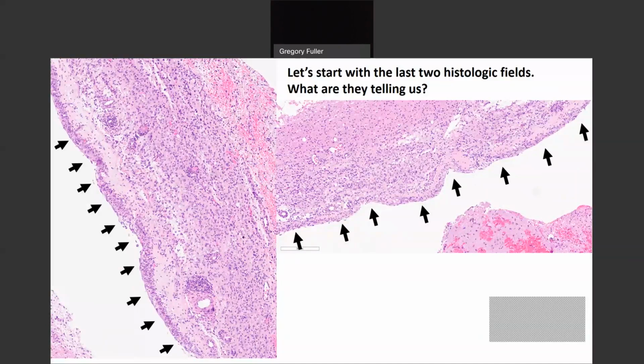Now that's informative. Now, how do you recognize that? Maybe for the neuroradiologist, it's not so intuitive. When we're looking at tissue fragments, you can see natural boundaries. This would be like, say, the molecular layer, the pia, at the surface of the cortex, surface of the cerebellum. You can see sharp cuts, which would be scalpel cuts, either from the surgeon or more from the pathologist when we cut squares of tissue and put them in the blocks.